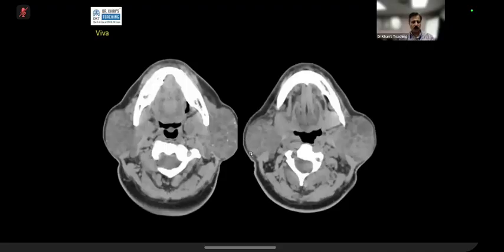Okay, over to you. What is happening here? I'm provided with a CT image. What I can see is that the bilateral parotid glands are swollen with multiple hypointense lesions within, likely representing an autoimmune process that is involving the bilateral parotid glands.